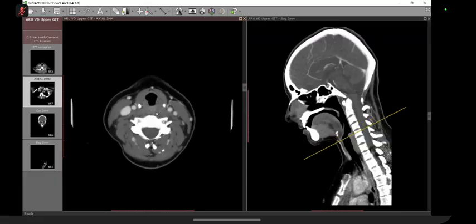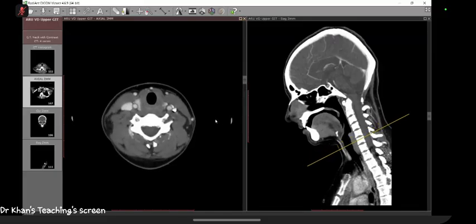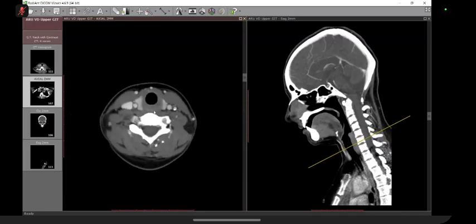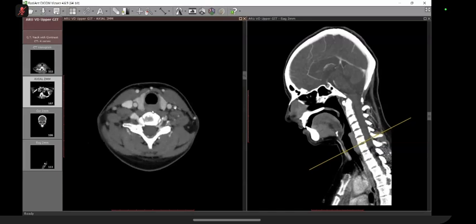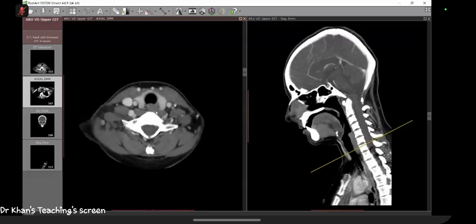And ultimately they converge into this nondescript type of soft tissue. Here you are. 1, 2, 3, 4, 5, 6. So we are just at the junction of hypopharynx and the upper esophagus. As we go down, so we are at 6 now, right? 1, 2, 3, 4, 5, 6. And you can see, this structure is the esophagus. At times, there will be a gas bubble there and you will see it much better. These are the cartilages of the larynx.